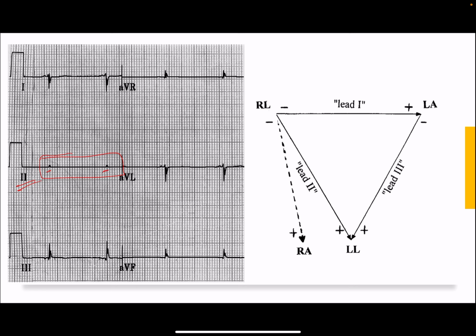Whenever you see this type of ECG with one lead showing an almost isoelectric line or very small complexes of 1 millimeter, then always suspect that the right leg electrode is reversed, placed over either the left arm or right arm. Always remember this. In your next ECGs, all other limb leads will have some complexes, but definitely one will have either a nearly isoelectric line or a very small complex. If you find that, always repeat and recheck the ECG and make sure the leads are connected properly.